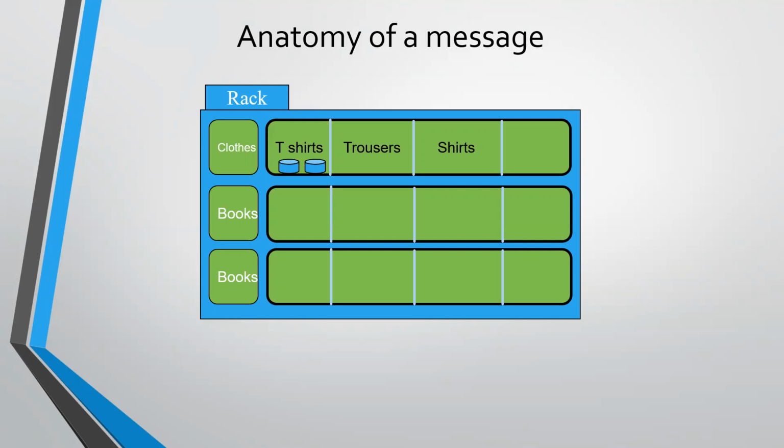Now, when you register a patient, you are capturing a lot of data elements, right? First name, last name, date of birth, gender, SSN, email address, their physical address, everything. And each of these data elements has a dedicated placeholder in the HL7 messaging structure. So the basic principle of HL7 is based on the fact that there are events happening in the real world. And when the data is being transacted in the form of a message structure, the actual data elements that have to be transacted have a dedicated placeholder in the HL7 message structure. Let us see that by looking at the HL7 message structure.